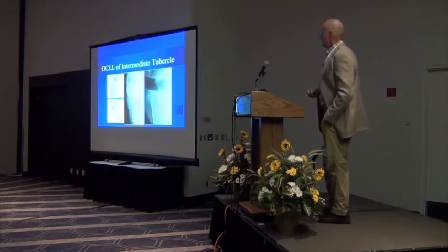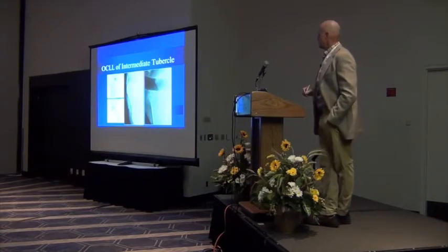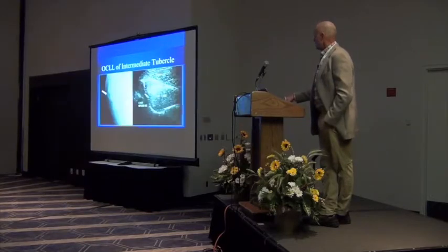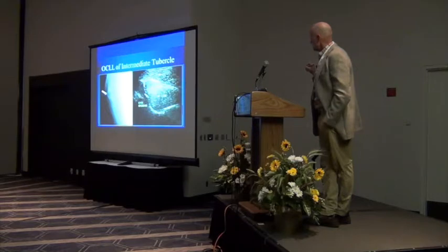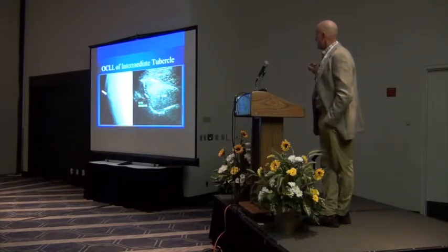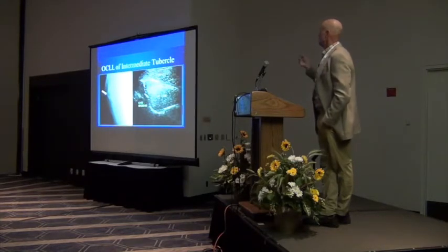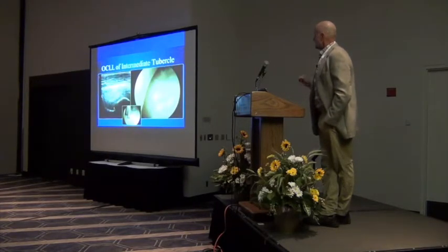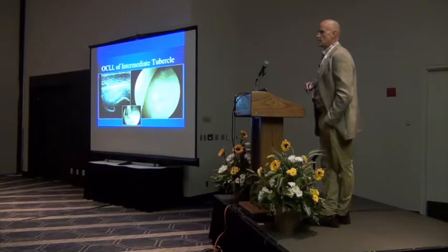They usually seem to respond to intrathecal injection of steroids at rest. The occasional one that gets really big, we've had to go in and inject, but this is just kind of like what you would see, a break in the contour. And it depends on where the cyst opens into that area. But this is actually one that occurred on the intermediate tubercle, and that's what it looks like. But this is the one that we had to go in and inject.